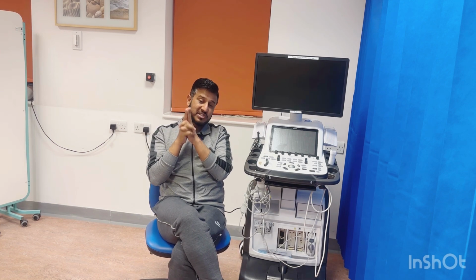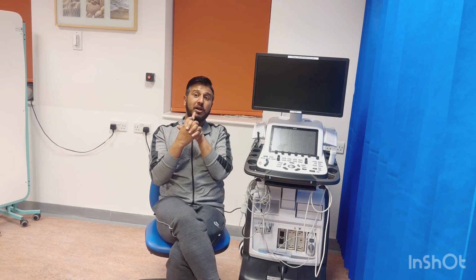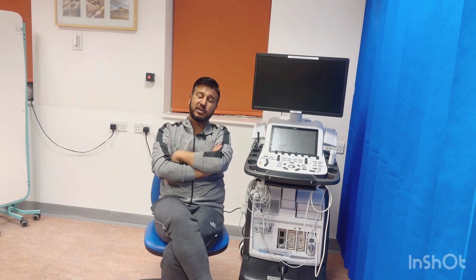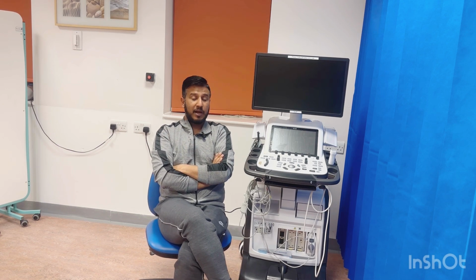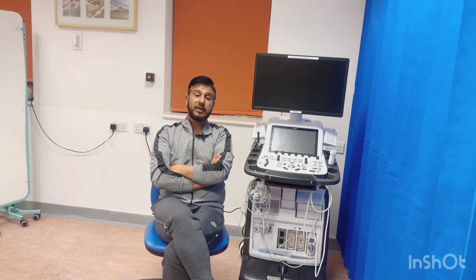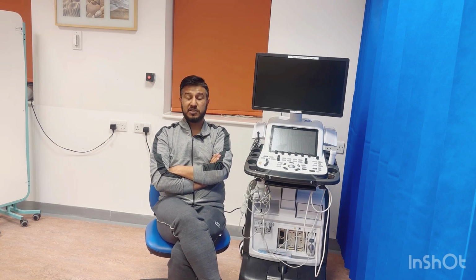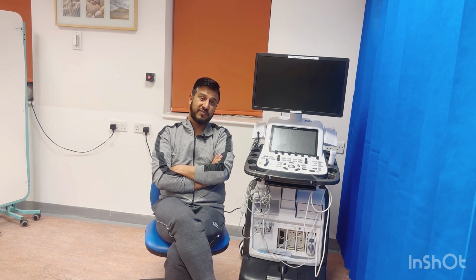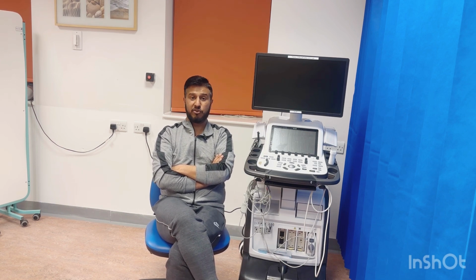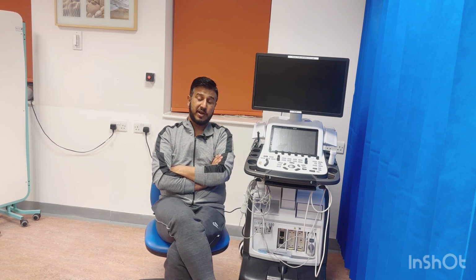But I would suggest that two things you need to keep in mind. Once you are tracking the pressure half time, look at the other parameters which can cause LV high filling pressures, and also look at the other parameters of aortic regurgitation as well. If other parameters of aortic regurgitation are not suggestive of severe aortic regurgitation, then you need to pay attention to whether it's severe or not, okay? Don't only rely on pressure half time.